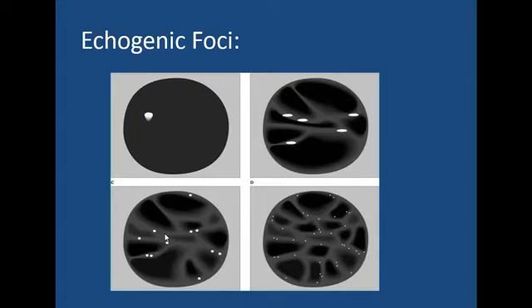And I do think that the most challenging thing we face when we use TI-RADS is to tell: is this true calcification or not? As I mentioned, when you have calcification with a large comet-tail artifact greater than 1 millimeter, this comes with the cystic nodule, and you will give it 0 points. And sometimes you will have a linear echogenic line, and this is just due to interference of the tissue component of the nodule itself, and you will give it also 0 points.